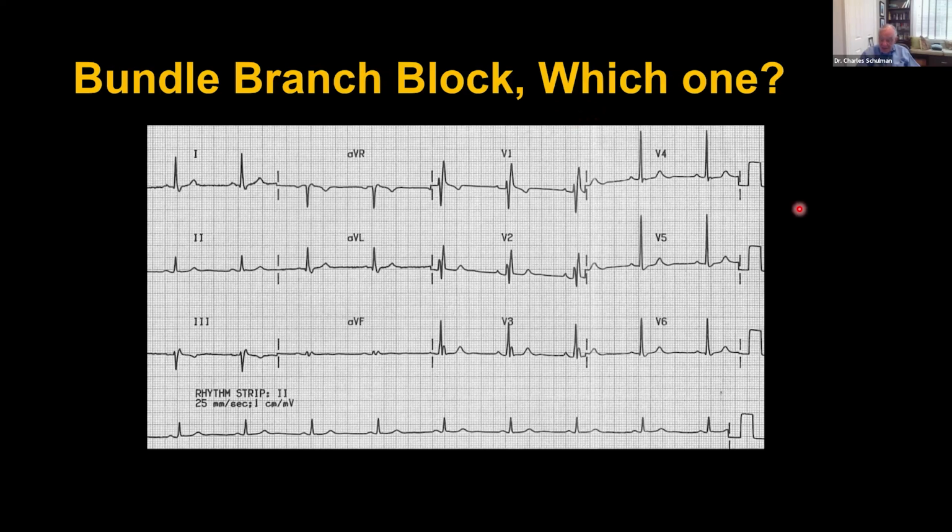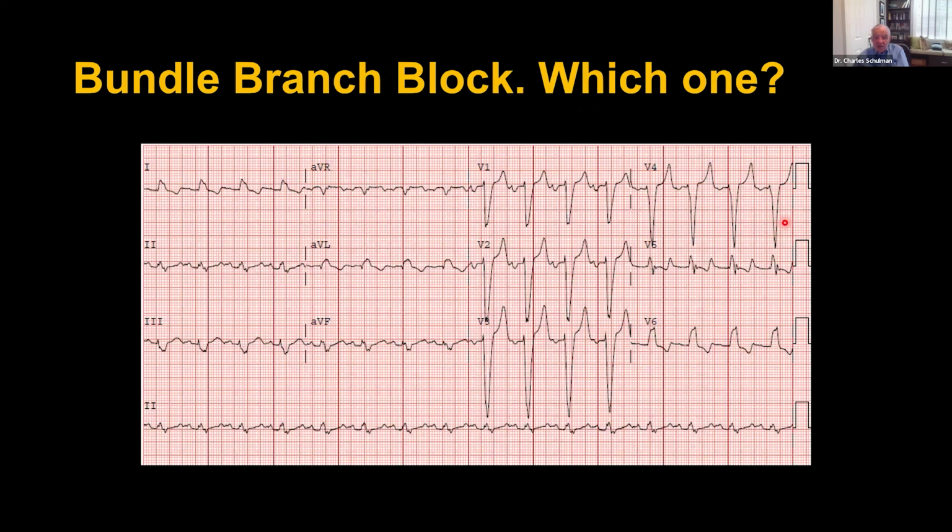All right. Here's the next one. Again, wide complex, greater than 120 milliseconds. This is the appearance in V1, with splintering in V6. And is this right or left bundle? You want to put answers in the chat? Left bundle. Correct. Okay. Here we go.